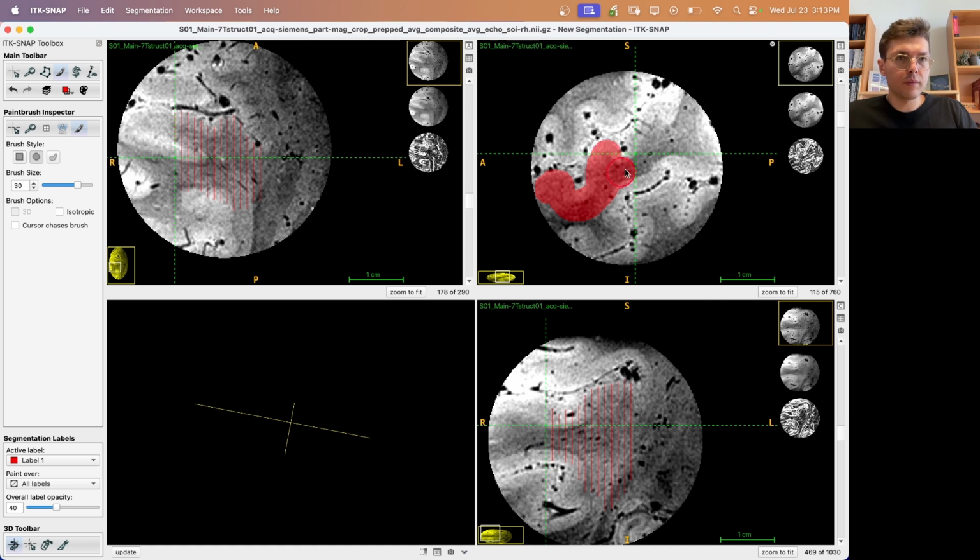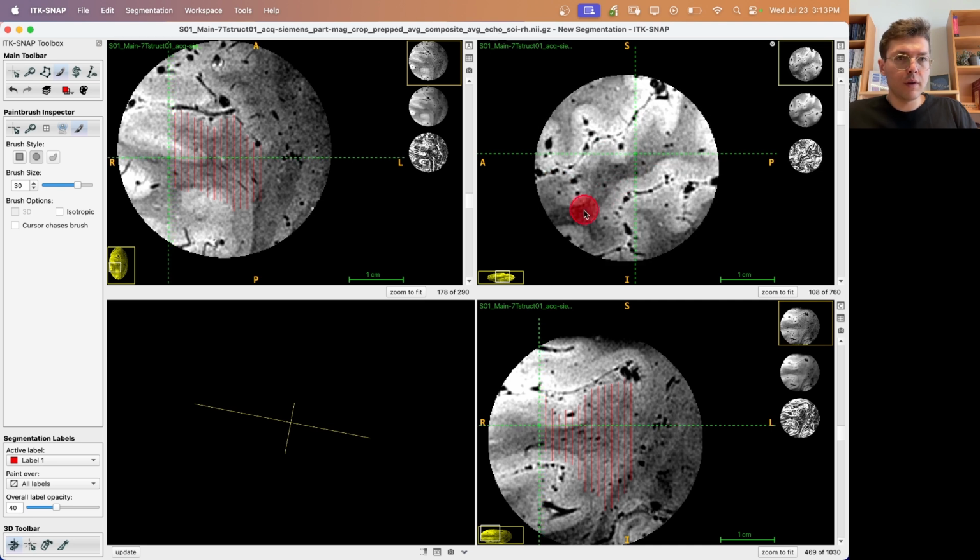Okay. I think we have more or less arrived at the more lateral side. I can notice that by the shrinking of the scoop as I'm moving from medial to lateral direction.